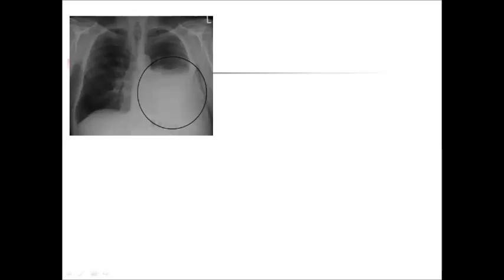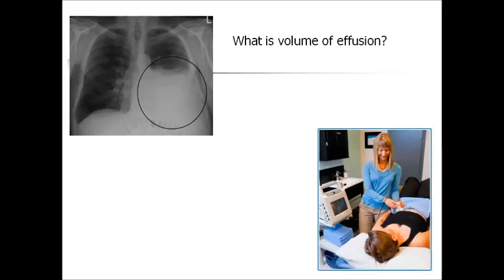Look at this picture. It's a plain X-ray of the chest with a huge amount of pleural effusion in the left pleural cavity. Can you answer the question, what is the volume of effusion? No, plain X-ray doesn't give us the opportunity to answer this question. But if we proceed with ultrasound investigation, we will get an answer.